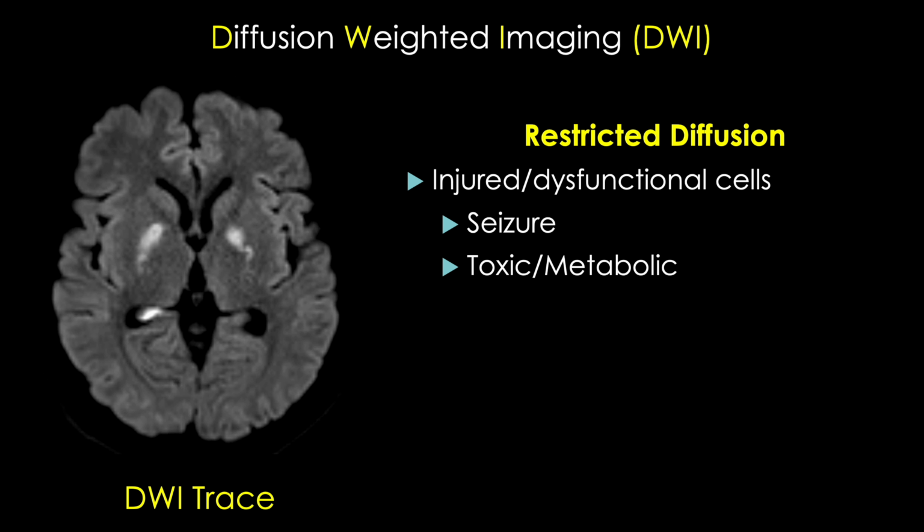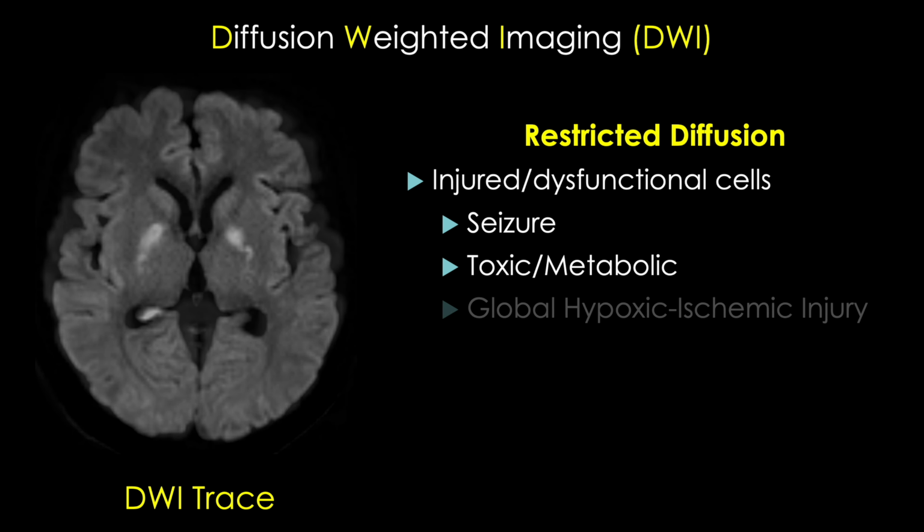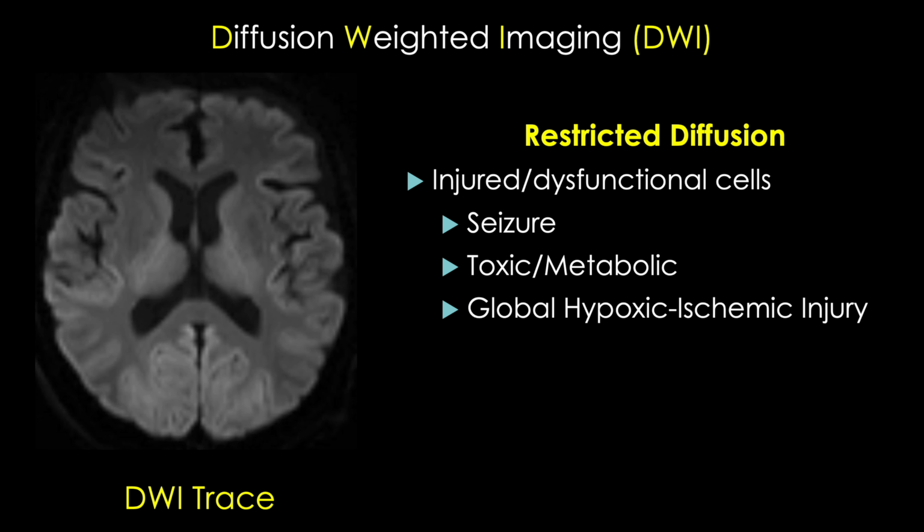This is a systemic process, which makes sense why we see so many different areas of the brain being affected in a somewhat random pattern. Metabolic disorders can also present like this, both inherited and acquired, although the clinical history and lab tests are crucial in solving the underlying etiology. What's most important is that you recognize this atypical pattern and raise the question of a toxic metabolic etiology so the clinicians can investigate further.